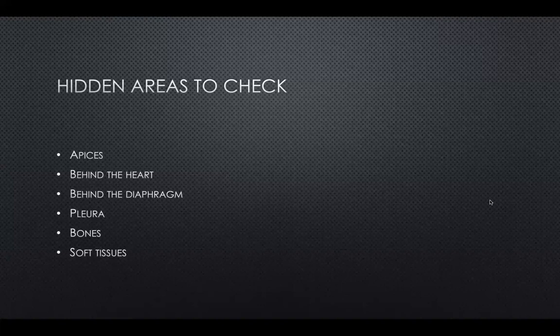I look around at the pleura just to see that there's no pleural thickening, any pleural plaques that you can see. Sometimes you can miss small pleural masses because it blends in with the ribs. And also very, very small pneumothoraces. Once I go through the pleura, any small pneumothoraces you could pick up just by making sure you look around there. Bones.